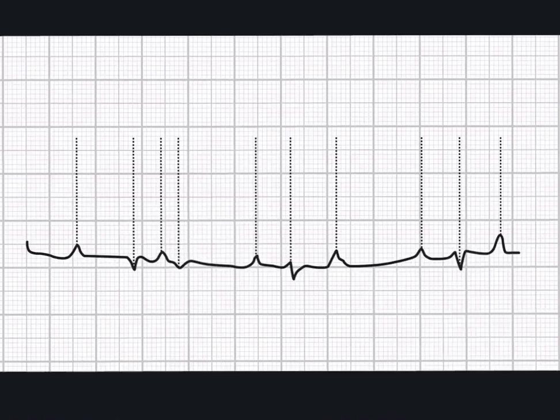This is a rather tricky case again, and we start by looking for the QRS complexes first. And we know that these are the most peaked parts of the curve, and this is one of them, for example, here, and one is here. And this one too. So we have 3 QRS complexes. This is number 1, number 2, number 3.